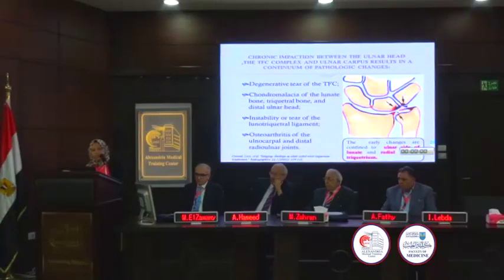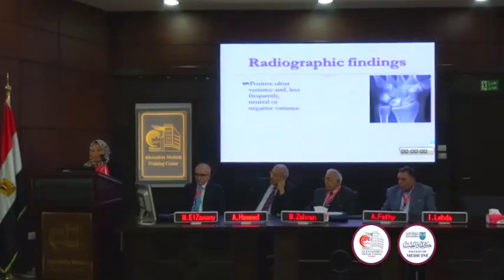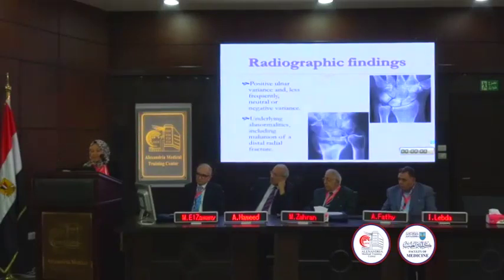This is very important to differentiate it from the distribution of bone marrow edema and chondromalacia from the other impaction syndromes. The plain X-ray will be able to identify the positive ulnar variance, as we see here that the ulnar head is projecting more distal to the radius, and other abnormalities, like this patient with malunited distal radial fracture resulting in shortening of the radius relative to the ulna.